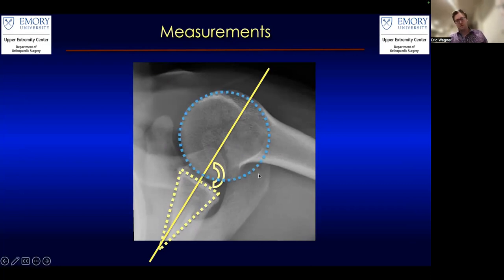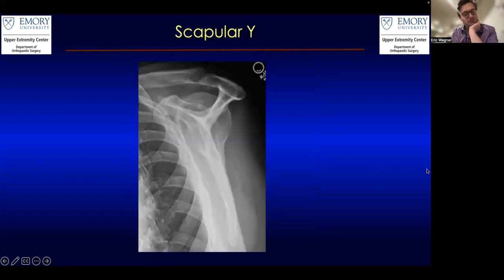So this should be a nice symmetric view. You have a good X-ray, and you'll see with arthritis, as I'll show you in a bit, you start subluxing posteriorly, you start having these funny looking tilting or bone loss posteriorly, start changing. But you can see here, this has a very nice equal distance between the circle splitting the humeral head.